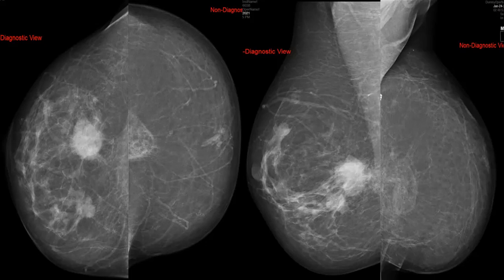Okay, so there is skin edema and there are band-like strands, you see, extending towards the nipple between masses and going toward the nipples. So you have questions for multicentric disease. Definitely you have multifocal, with questions toward multicentric disease and questions for pectoralis involvement. Yes.